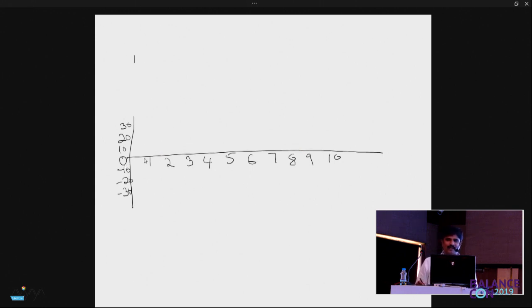Now, if an eye tracing comes like this, excuse the little bit of slant, what does it mean? The eye is looking straight ahead. The eye is not moving in the horizontal plane. So flat means no movement.